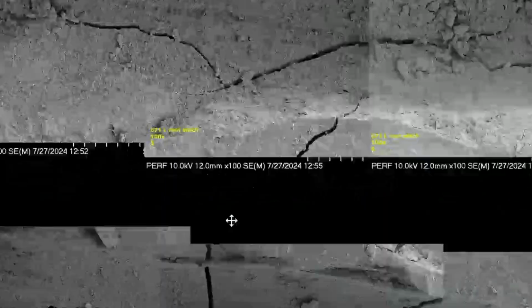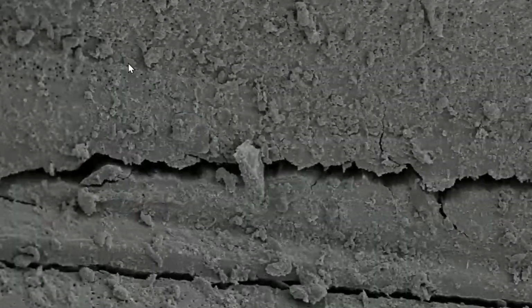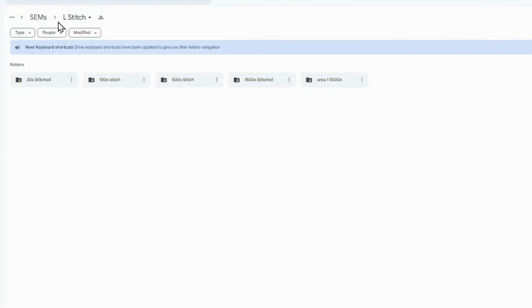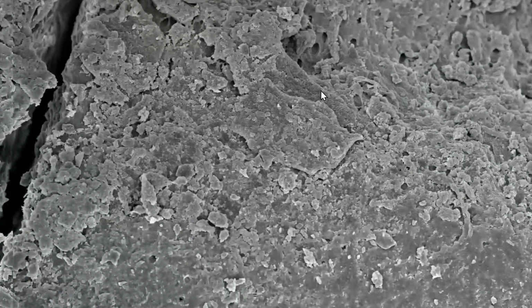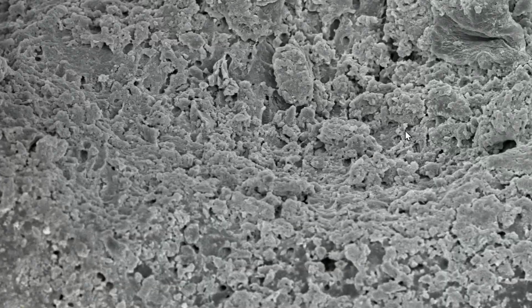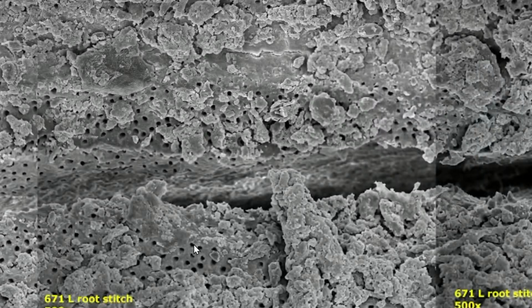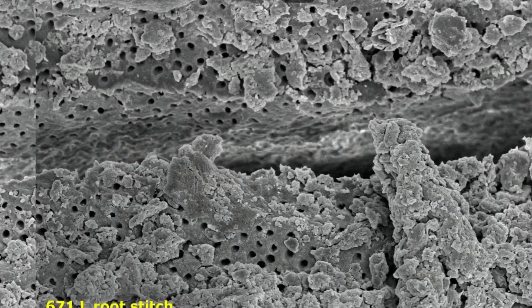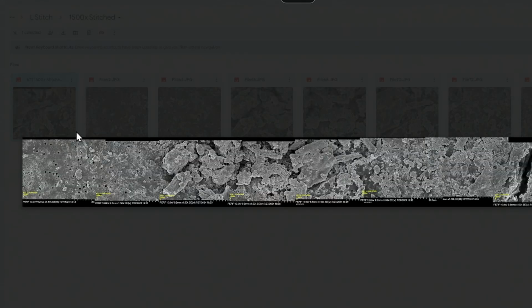In other areas where the instrument didn't touch, you have open dentinal tubules. But it has a classic laser look to it, in that it looks like a hurricane or a volcano has gone off, with a distribution of demineralization and layers of predentin still present in other areas where there are open dentinal tubules.